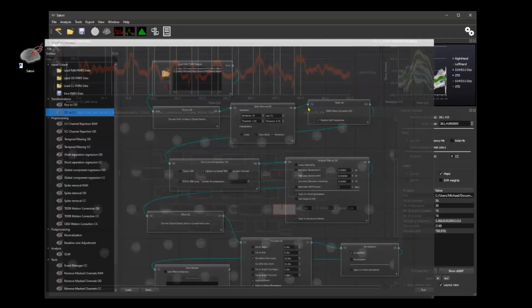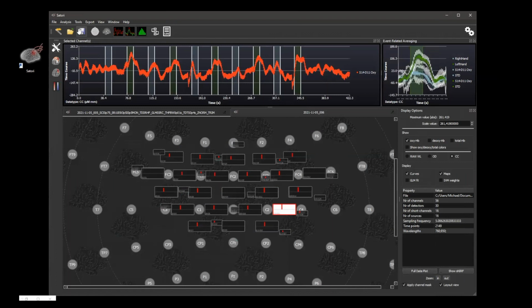Well, let me shortly check if we have done the right one. So here, I want to shortly save the data because I've added the protocol, so I've saved the data.